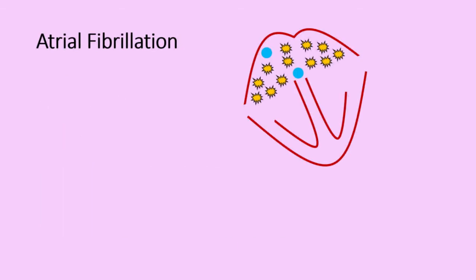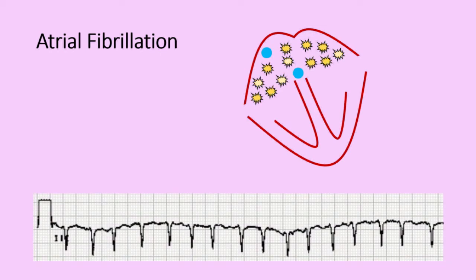One of the most common arrhythmias that you will encounter is atrial fibrillation. In atrial fibrillation, you have many different areas of the atria that are irritable foci and continuously shoot off impulses. When looking at an EKG strip, what we end up with is the classic irregularly irregular rhythm. What this means is we don't have any visible P waves, and our QRS complexes seem to come randomly with significantly varying intervals. This is because as these different foci shoot off electrical impulses, they are randomly able to make it through the AV node.